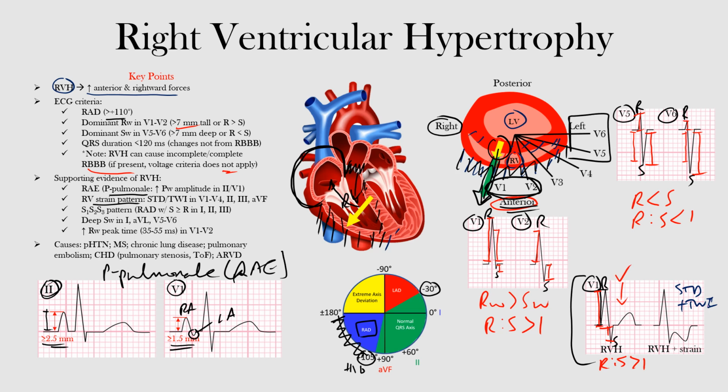Now, one thing to note is sometimes with the greater R wave amplitude, the greater the ST depression will be, okay? So the greater forces going up in the R wave, sometimes the greater forces that we'll see with our ST depression, okay? So that's something to look for.